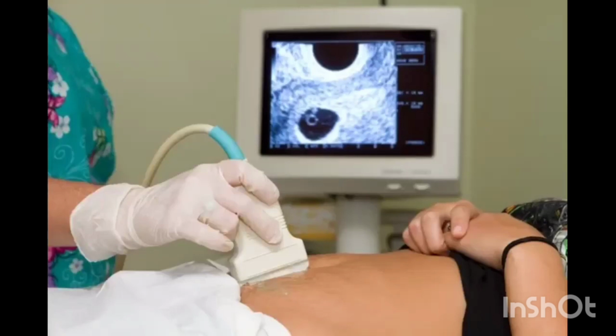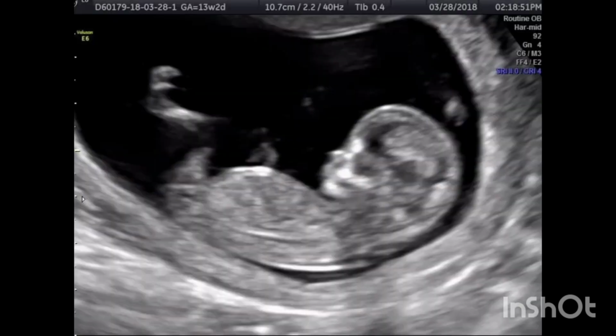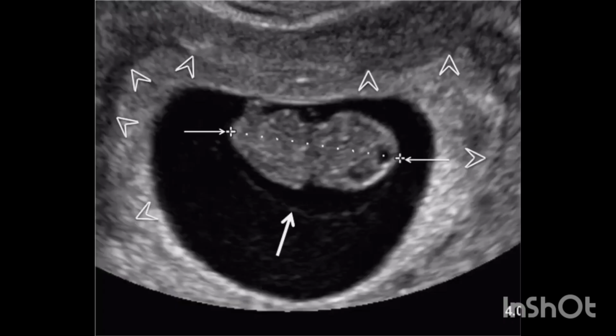First trimester ultrasounds are not a requirement for all pregnancies to confirm viability. However, if any high-risk features, such as advanced maternal age, twin pregnancy, and/or clinical concerns are present, such as irregular menses, vaginal bleeding, more than one ultrasound may be performed at the clinician's discretion. With the first ideally in the late first trimester between 10 and 13 weeks. However, ultrasound exams before 10 weeks are common and can still be used as accurate assessments for most necessary clinical determinations. It may be utilized as a part of the standard evaluation during pregnancy or to elucidate other concerning signs and symptoms.